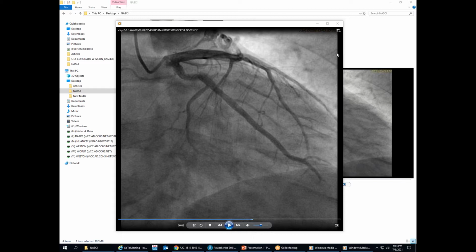I'm pointing with my cursor, you cannot see it, but Ian, you can point at the pulmonary artery, the MPA, and you can see if you're getting confused if that's the MPA or the aorta. Your pulmonary artery is always going to be the most anterior structure on the heart. Just think on cross-sectional. It's always the most anterior structure, other than in TGA cases and funny congenital cases. Your pulmonary artery should be the most anterior structure in the heart. So you can see there is the most anterior when you follow the cardiac contour. So that's going to be your pulmonary artery opacifying with contrast.